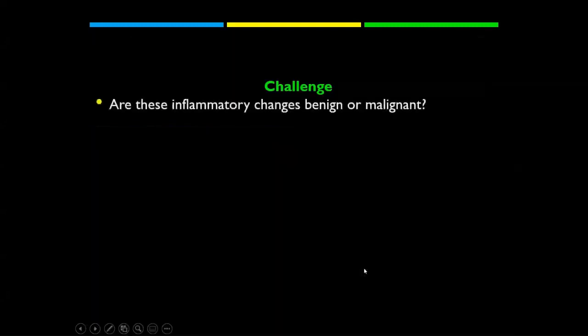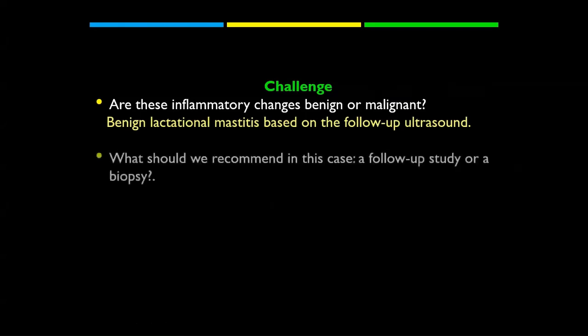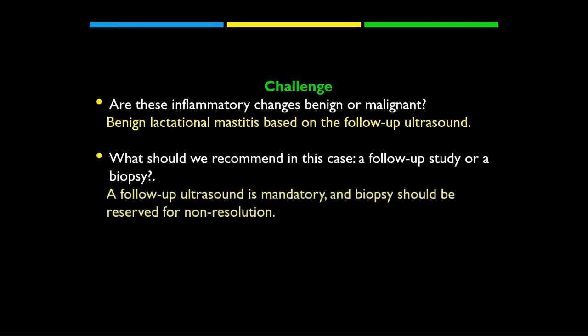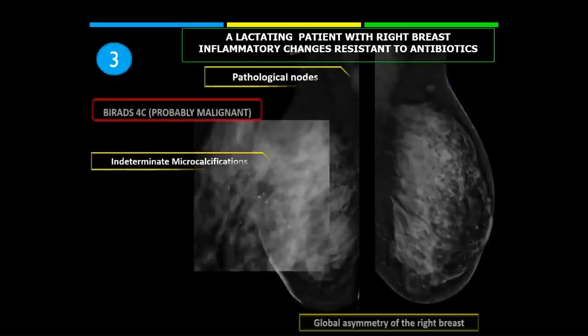So the challenge in this case: are these inflammatory changes benign or malignant? We cannot say based on the first examination. We can only confirm it is benign based on the follow-up ultrasound examination. And what should we recommend? As we said, we should give her a short course of antibiotics. Non-resolution after 10 days is an indication for biopsy. And this was a case of benign lactational mastitis.